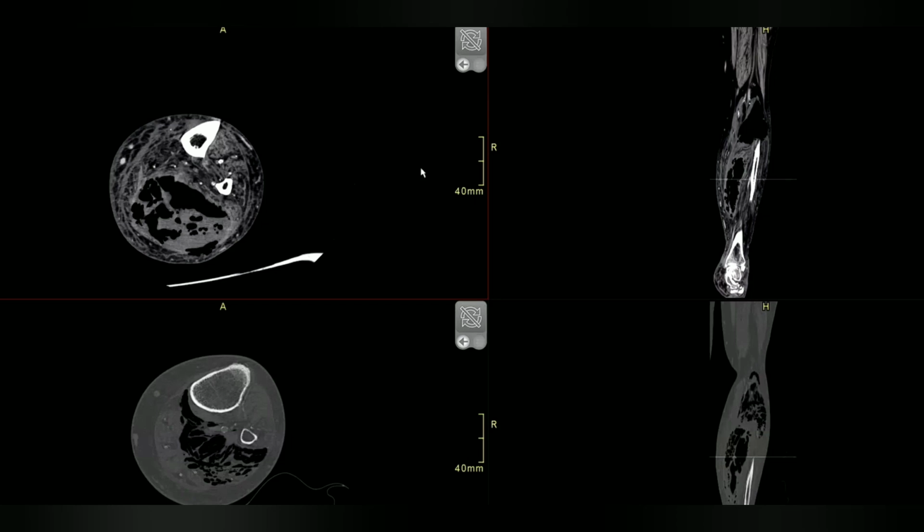So this is necrotizing fasciitis and necrotizing myositis. And you can see it in the lower limbs, in multiple places. And this is a renal transplant patient, so he is immunocompromised. So this is an aggressive infection. As soon as you saw the radiograph, you need to alert the surgeon, number 1. You would say that there's extensive subcutaneous emphysema, tell the surgeon, and arrange an urgent CT for the patient for confirmation.